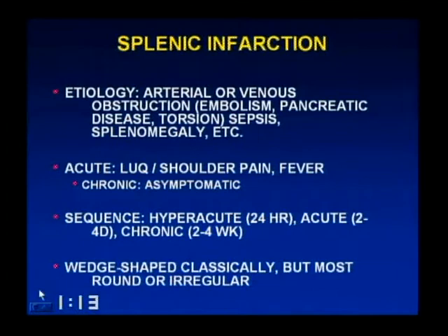So anytime you see a big spleen due to infiltrative disease or any of the host of diseases that give moderate or marked splenomegaly, it's not uncommon to see foci of hypodensity that actually are infarction on cut path specimens. Now, differentiate between acute and chronic infarction. The natural history of a splenic infarct, again studied in these older experiments, is one of healing. Actually, the vast majority of splenic infarcts are small, they're actually round or irregular, and they heal completely.